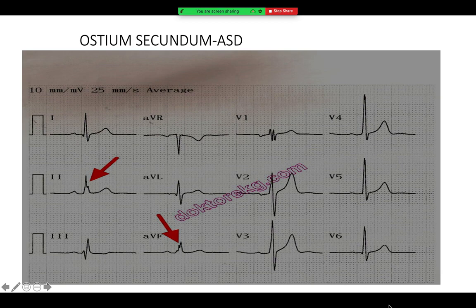Please feel free to use the chat box. What do you notice? So as we already said, to help you, we can already see there are some arrows over here. Any guesses?